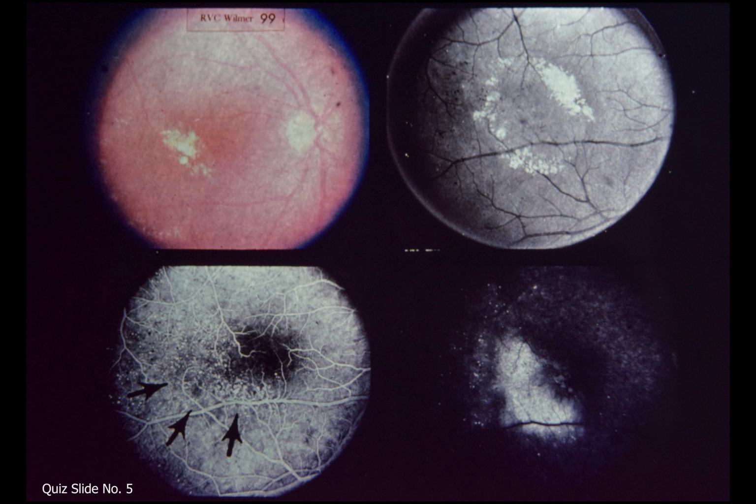Branch retinal vein occlusion may occasionally produce a picture like this, but there is no evidence of venous obstruction in this patient. In addition, the vascular abnormalities are not confined to the distribution of a single venule, as is the usual case with branch vein obstruction. The dilated vascular segments visible on the fluorescein angiogram lower left are rather typical of what one sees in retinal telangiectasis, or what some have called a variety of Coats disease.